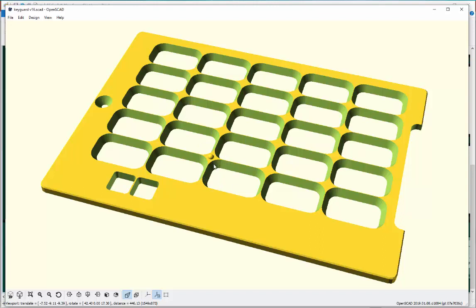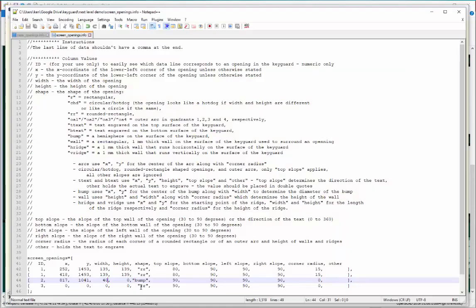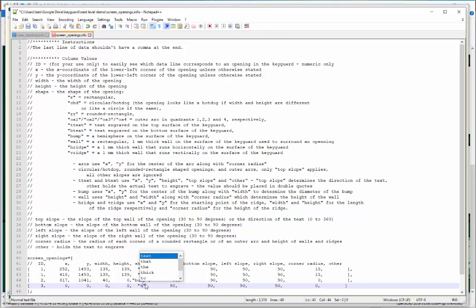If you go beyond this platform, your printer is going to have a little trouble printing it because it's going to be printing part of that button out in space and could actually result in a failed print. So do think about things like that, and don't put objects out in space with nothing below them. 3D printers have trouble when you do that sort of thing. So our bump is ready, and the last thing we need to do at this point is put Eddie's name up here, and that means we're going to be using some top text, T-text.